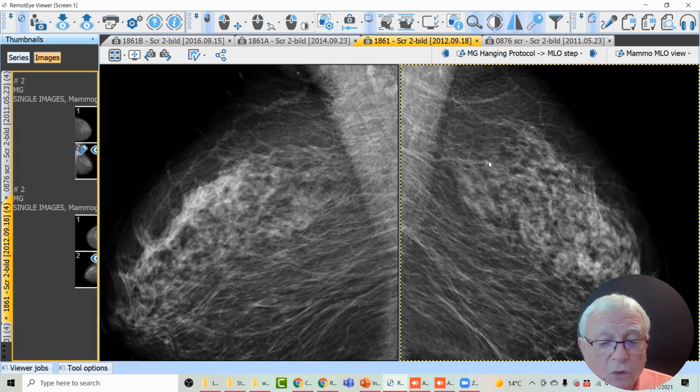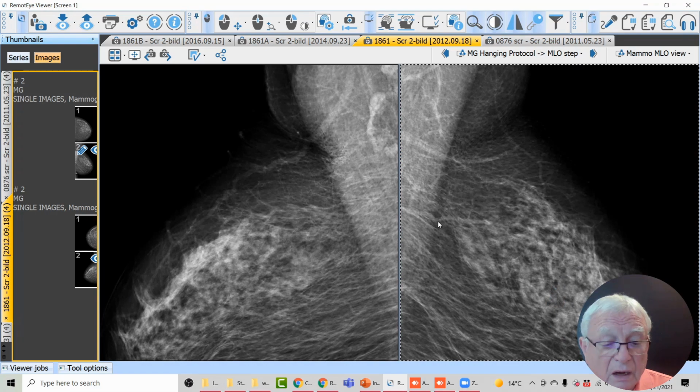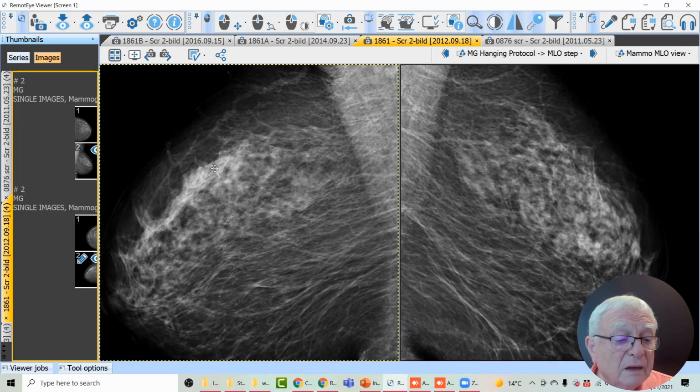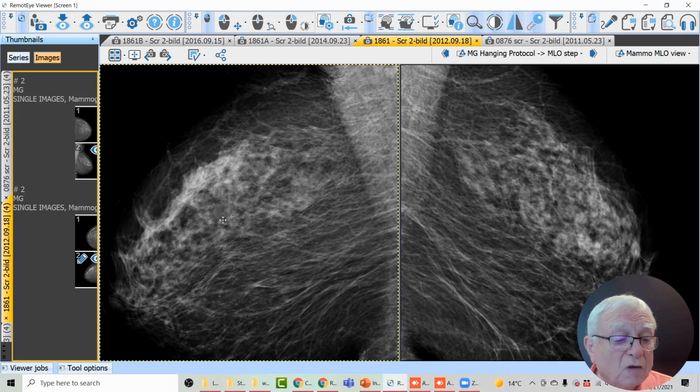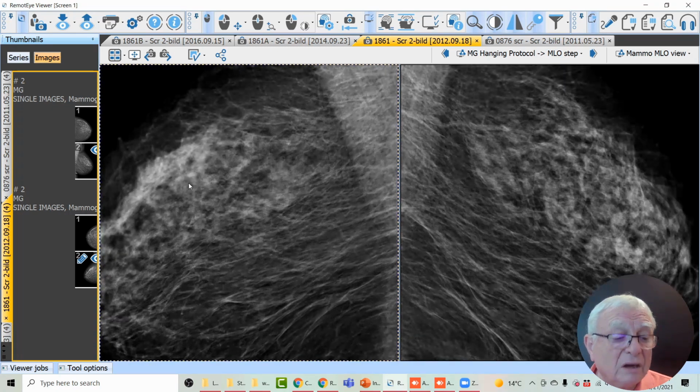Later on, we are going to talk about the Milky Way. I don't see any asymmetric density or calcifications. I look at the contour. And then you thought that this was a density. Did you see what I did? I darkened it. And I suddenly see TDLUs and TDLUs and fat and fat.